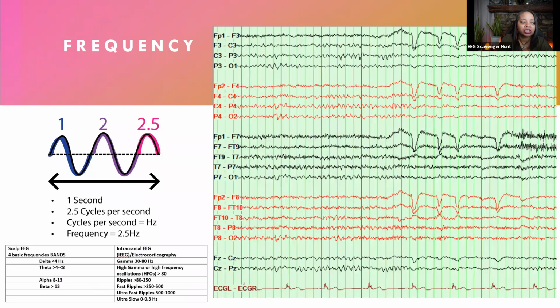Now, if you measure EEG intracranially, you can get much faster waveforms. If you're measuring from the scalp, you are measuring through the scalp, through the skull, through the meninges, and then those electrodes are picking up the brain. That's a lot of insulation between your electrode and your brain waves. If you're measuring intracranially and you've taken off some of that insulation, then you can see faster frequencies there. So these are some of the faster frequencies, also the slower frequencies. This is not the purpose of today's introduction, but you can just see that there's a lot more to learn.